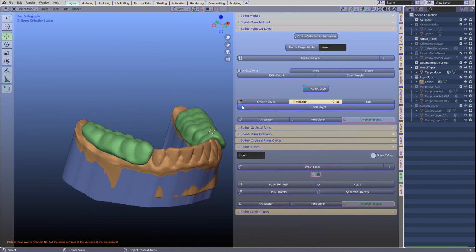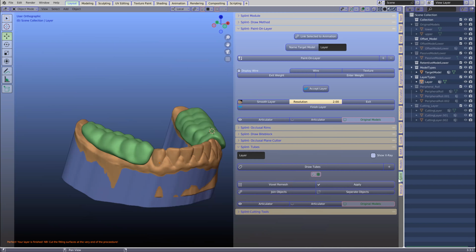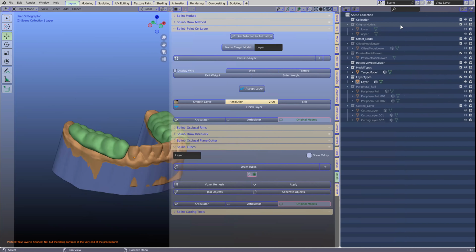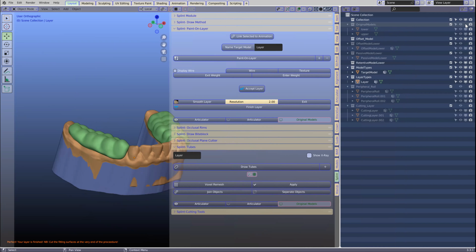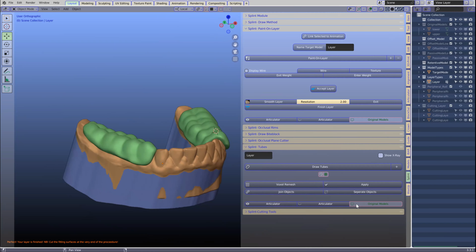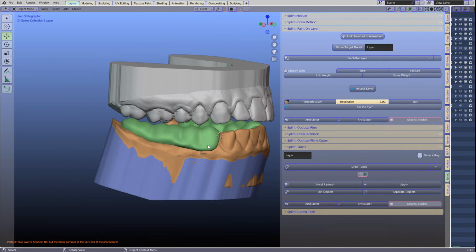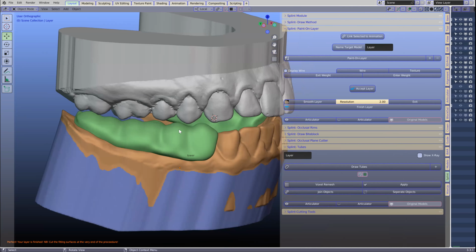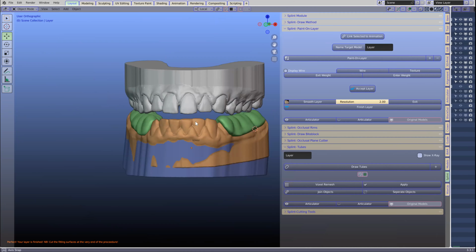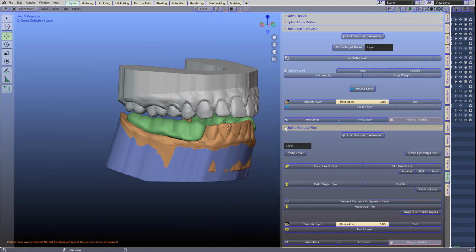Now what we want to do is we want to see the original model. So look for a button called original models to see your upper model. If you can't find a button, it's always in the outliner window here. But okay, so this is a filter section here. So here, original model, but you should find it because there's quite a few original model buttons because we want to see the top. Now, we've got stuff missing. So, I mean, we need to add material, right? So what we're going to do is we're going to go to the occlusal.